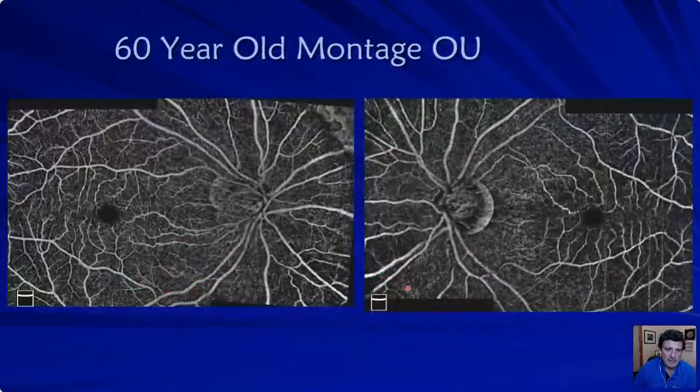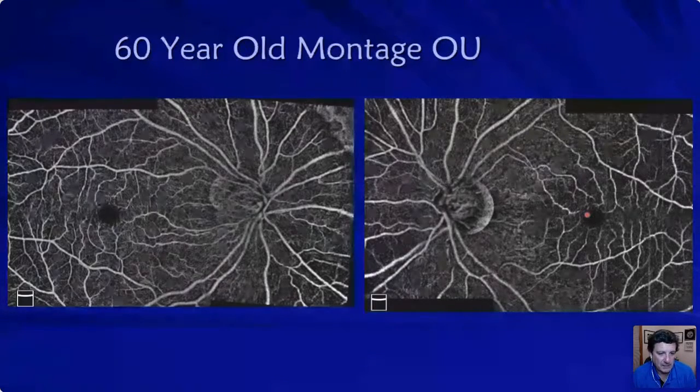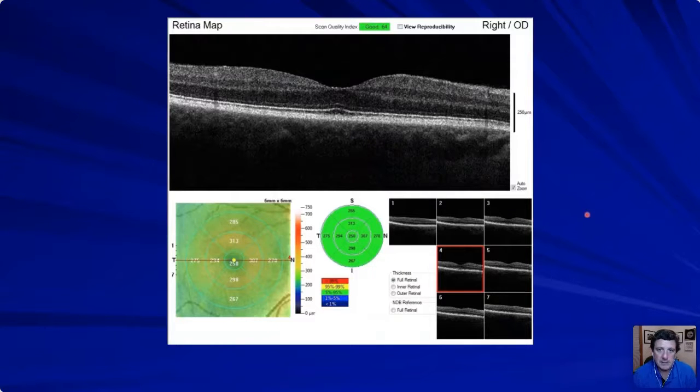So you can take and montage these images, which is really, really cool. Here's the optic nerve. Here's the retina. You could just see how these capillaries pan out, which really makes this kind of scan important in maybe glaucoma and in diabetes, and then looking at the vasculature for macular degeneration for the other scans down at the choroid level. So this is, again, just what a normal scan would look like.